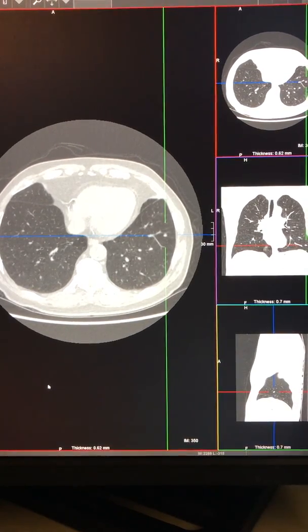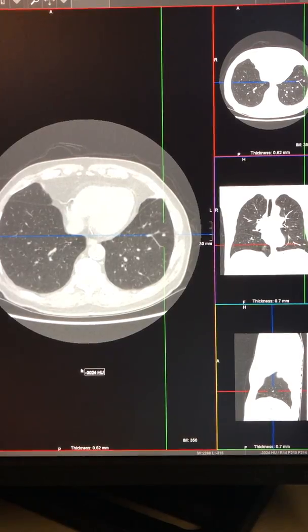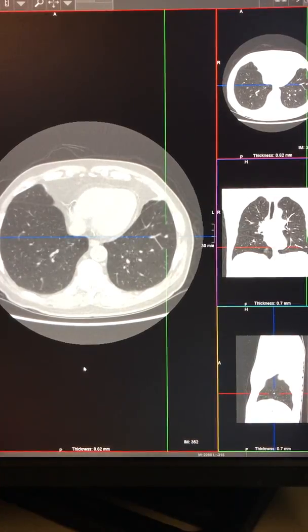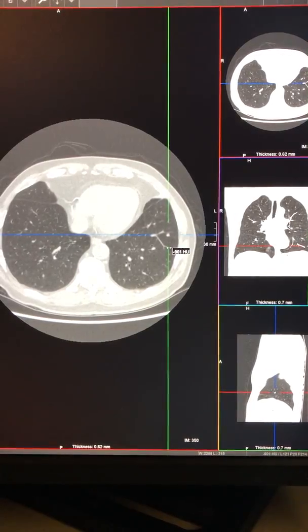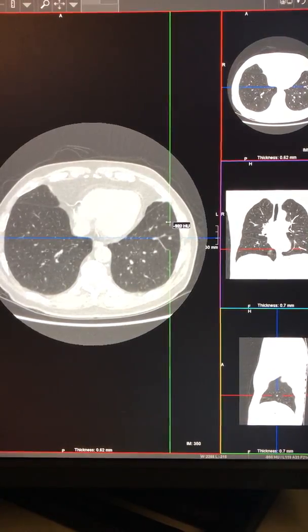In this tutorial, we're going to look at some of the practical points used in assessing a lung nodule. The guidelines on determining the follow-up frequency of lung nodules vary according to publication, and currently the best used references are the Fleischner Society and the British Thoracic Society.